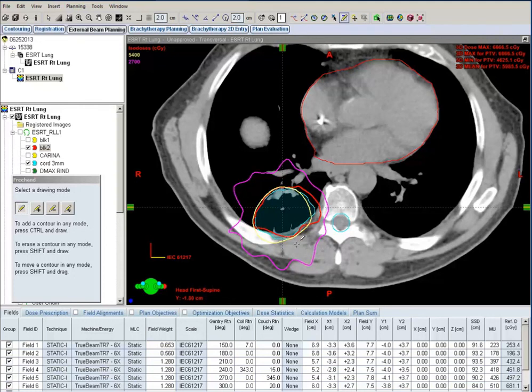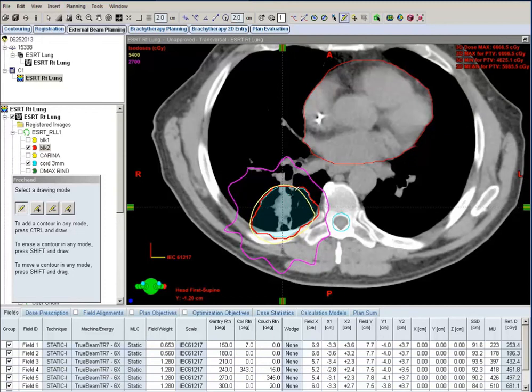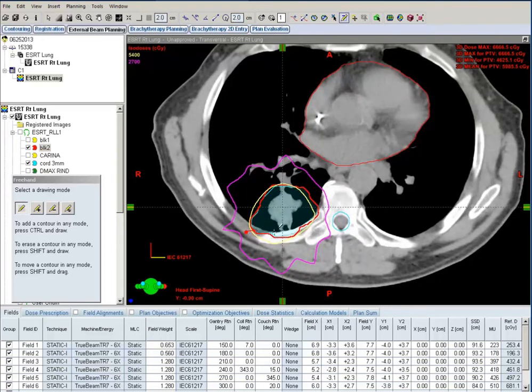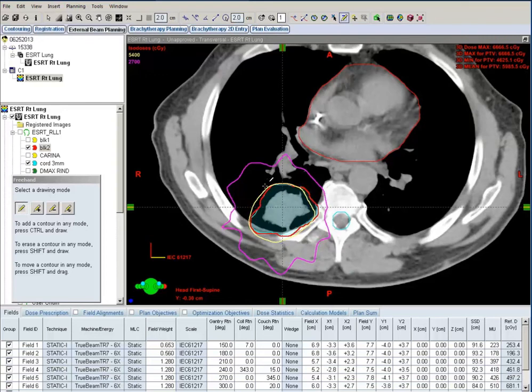Now bring in the block 2 contour. One thing you'll notice is that close to the cord or areas of low density, we don't cover as well. And here, closer to the chest wall and the ribs, we have areas of overdosing. That's pretty typical for these plans. Using this block 2 contour is just a real easy way of re-snapping our MLCs instead of hand editing each of the MLCs on each field. So I'll continue to edit block 2 throughout the PTV volume.